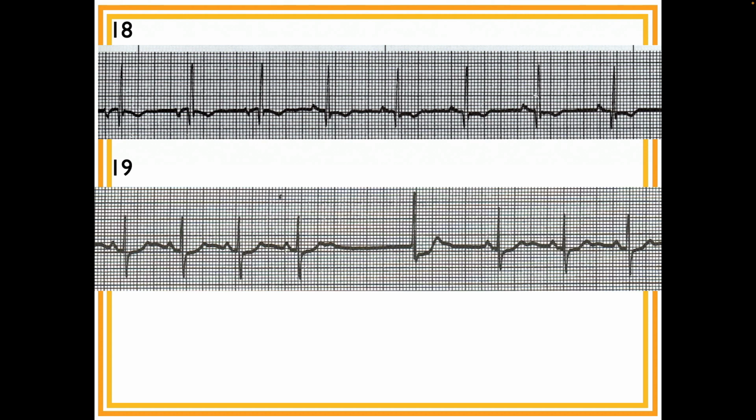The rate is about 70-ish. P waves are present up until that pause. So I would say normal sinus with one sinus pause.